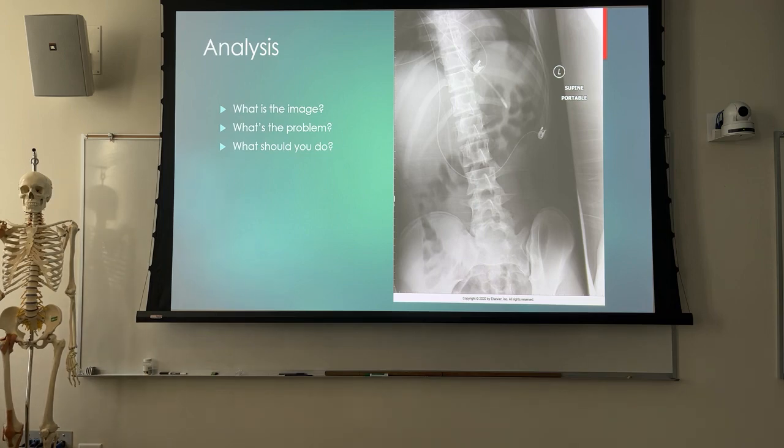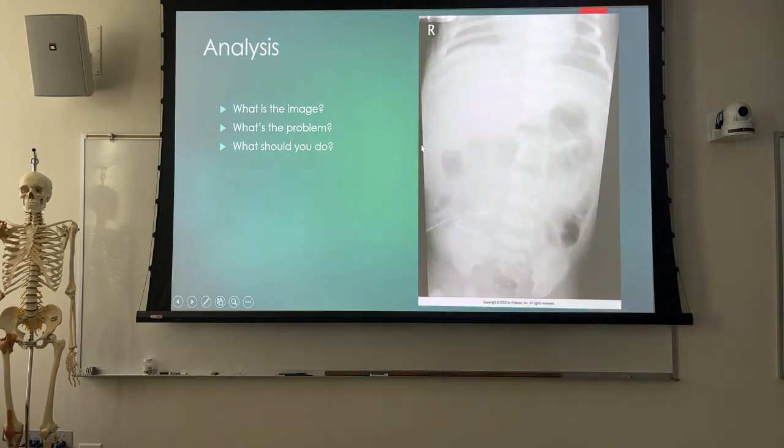So can you see what you need to see? Did you go up to see whether or not the feeding tube was in the right place? Can you see that? Yeah. Even though this is just, plus this is a young patient too. See the epiphyseal plates? Can I go blast that patient a second time? That's probably the best, once they adjust it, right?